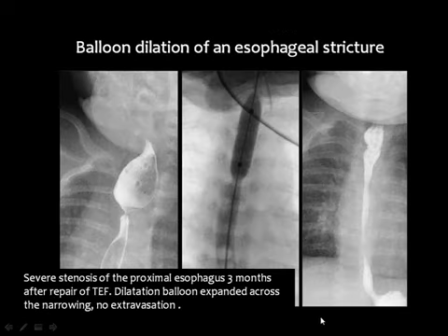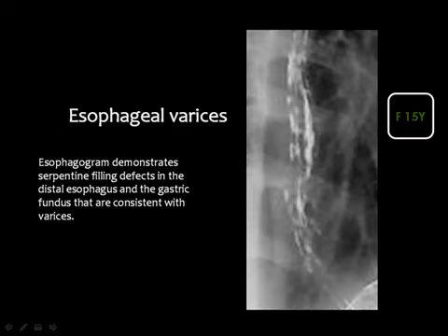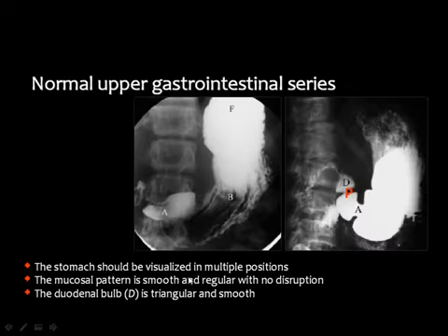to reflux esophagitis. And you all know we can manage these strictures in the esophagus and in some parts of the bowel by interventional radiology, introducing balloons, which can dilate these segments, resulting in a more or less patent lumen. And this is a simple example of esophageal varices, which appear as worm-like filling defects along the course of the esophagus in patients with portal hypertension.